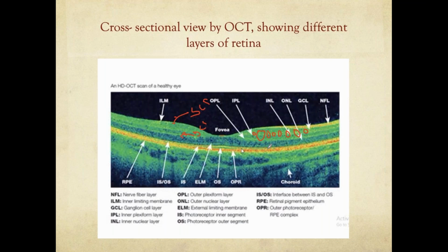You either put an Avastin or a triamcinolone, and later on the retina completely comes back to normal shape. But you will start finding out that the vision is still not good in that patient, because while the edema was present, the plexiform layers had already split. So although the retina comes back to its normal thickness, the connections between the outer and the inner retina have already been disturbed. So this is a very, very important finding for you to analyze in all of the OCTs.